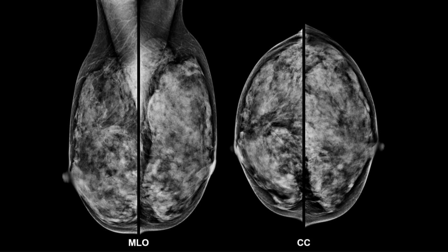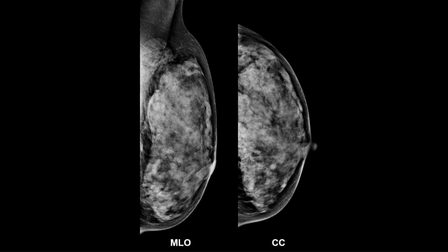So this gives you a quick opportunity to refresh what you are looking at, but start out the case by looking at what you commented on your page. Next thing I'm going to do is show you the breast of interest, which is, in this case, the left breast. And the next thing I'm going to show you is where the lesion is, which is there. This is the time when you look at your syllabus and see whether you put a mark in approximately the same location. Hopefully you did. And then we are on the same wavelengths, because that's what I'm going to be discussing.